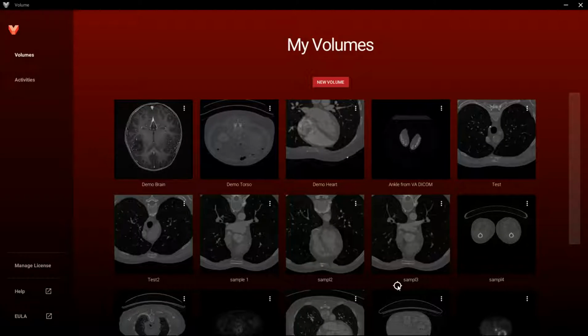We'll look at the ISO Window tool, Opacity tool, Preset Views tool, and the Isometric Views tool. This topic is covered under Volume Manipulation Tools in the User Guide, located down here in Help.